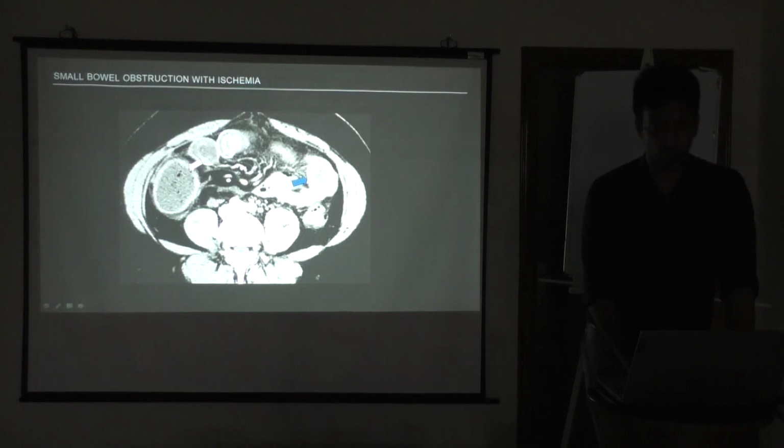The layers of the bowel wall are showing up. You can see this part of the bowel. Let's see, okay, this is also bowel, but why is there nothing like this? Because here the wall is grossly thickened. You can see how much it has enhanced, and in this you can see this is again mucosa, inside air is there, this is submucosa, but here some disparity is there, maybe it opened up. So if the enhancement is not being maintained, this hypo and hyper enhancement alternating, that is also a feature. Maybe it lost its blood supply completely, so ischemia has settled in.